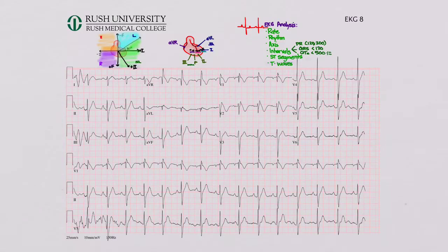Okay, so here we are on EKG number 8. Now this one's a little bit tricky, so you get bonus points if you get this right. I don't think you have to know this, but I'm going to show it to you anyway. But let's go through everything real quick again.